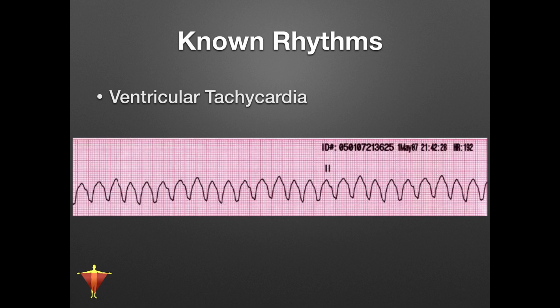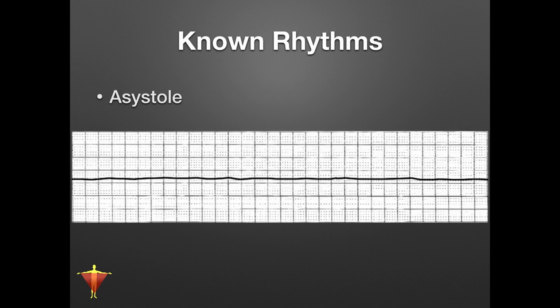Our next rhythm is asystole, or what is known as a flat line in modern TV days, right? Is this a shockable rhythm? No. Unfortunately, we see that pretty frequently on TV, but we know very well that asystole is not a shockable rhythm. In this case, we would just do something like continue CPR if it's something that we're already working, right? Or, whatever other considerations we need to take there.